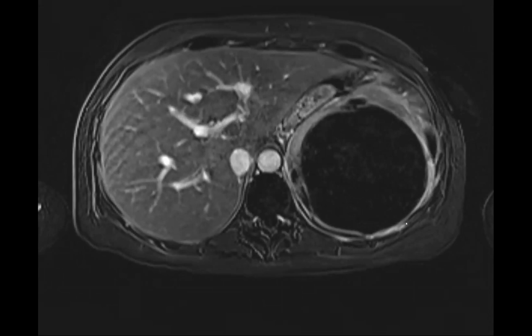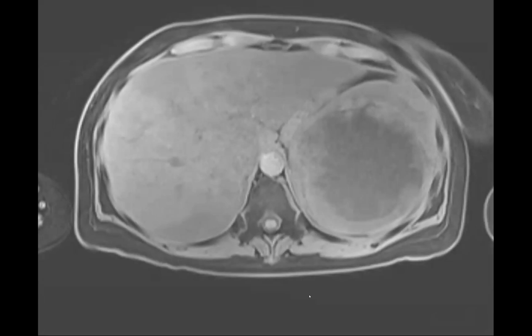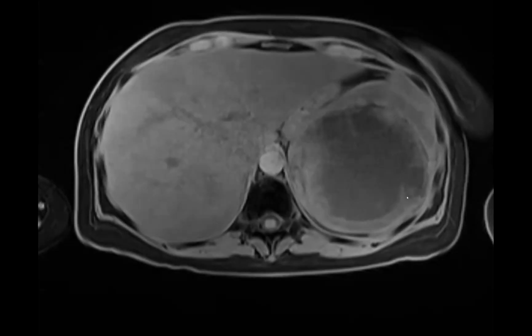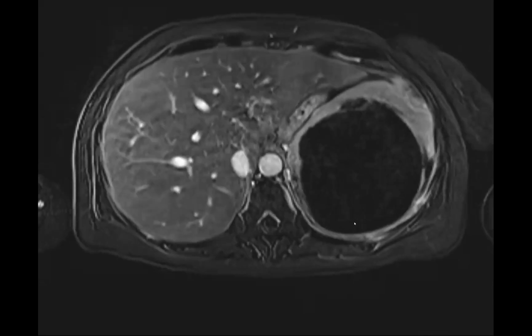the venous phase. Can you go to venous? Yeah, but this is the sub from the venous. I think the non-subs are a little confusing because there's a lot of... Yeah. See, there's a little bit of low level enhancement. Oh, wait, there's hyperdensity. So this is the pre signal. So I just think the subs are better here, but this is the sub.